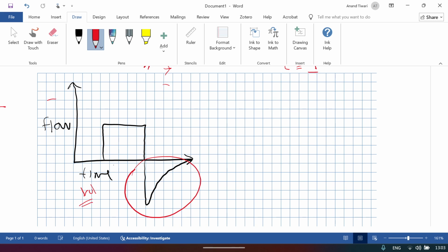So from this expiratory limb you can have a lot of information regarding the resistance and compliance problem. Let me explain that. If this is the flow time curve, and this is the flow, during expiration the peak expiratory flow is reduced. So this is now less, and you see that expiration time is prolonged. So there is a prolongation in expiratory time and reduction in the peak expiratory flow.